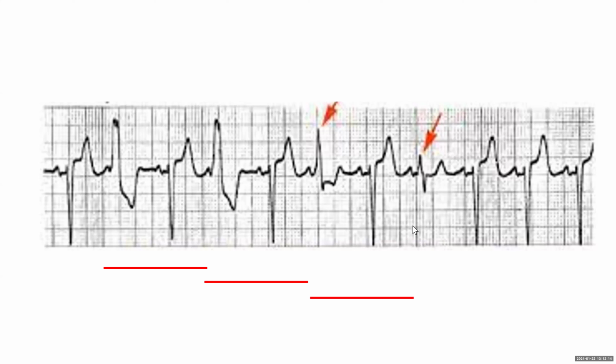So if you, like the lines here, take the interval between the PVC and the following PVC, it continues. كأنه ما في شيء underlying rhythm تحت. فإتس كأنها focus firing independent of the sinus rhythm or whatever rhythm is underlying. So this is called ventricular parasystole. Good.